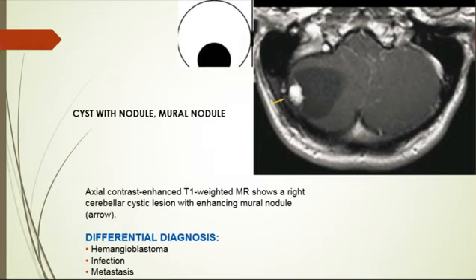With this appearance, okay. But the most common mass everywhere is metastasis. I think the primary is supratentorial. Supratentorial primary more common, do you think? Everywhere metastasis is more common. Don't worry, don't think about it.